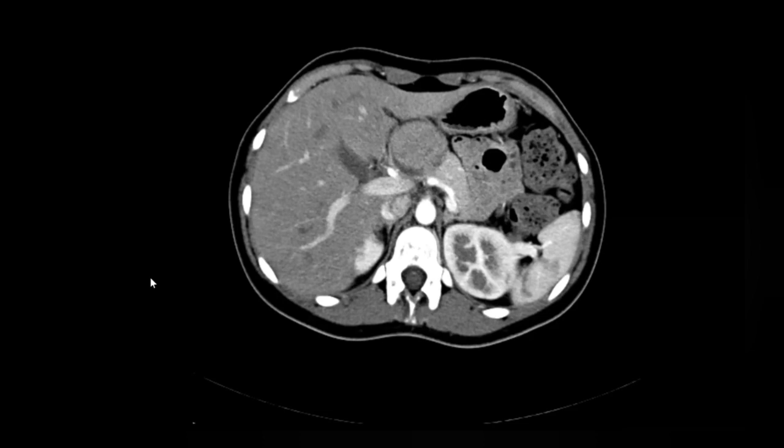Okay. So what's your differential now? Sir, pancreatic CA, with the provisional of pancreatic pseudocyst, but where is the pseudocyst? Is this solid or cystic? Sir, it is cystic, sir.